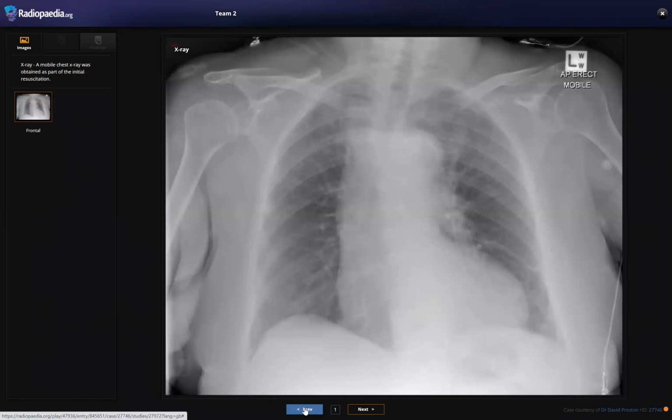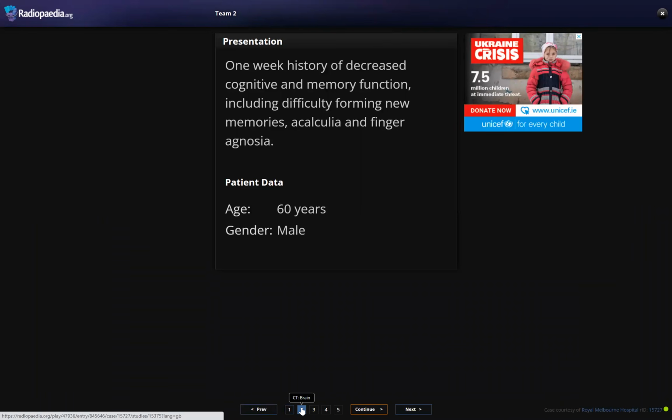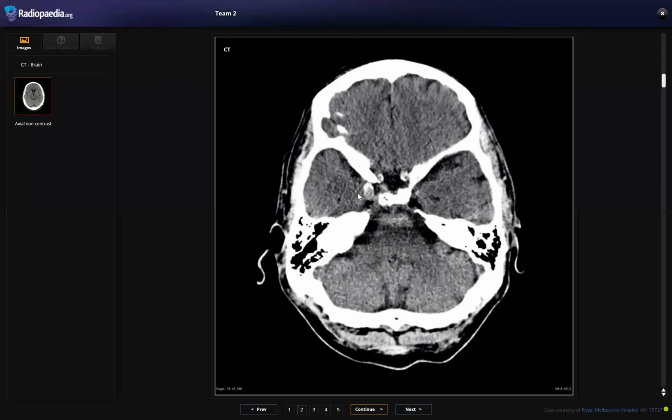Yes, as you mentioned, exactly. Yes, and this is an autoimmune encephalitis or limbic encephalitis. The CT brain was normal, was it? Normal, or from the history there is subtle hypodensity. It is normal here. It is normal, exactly.